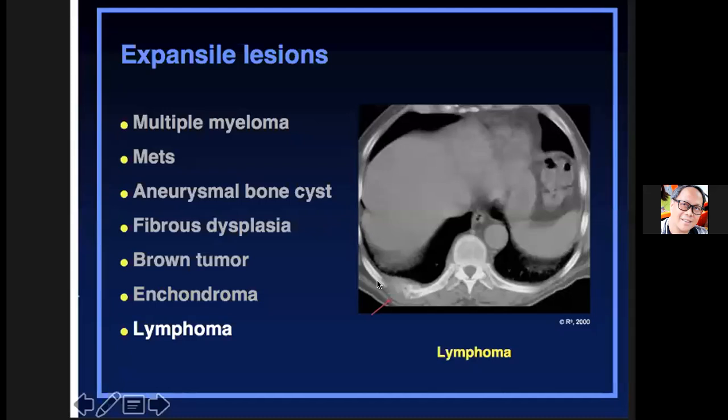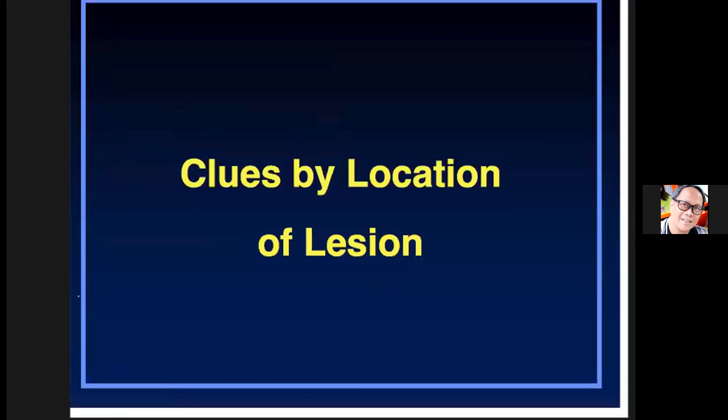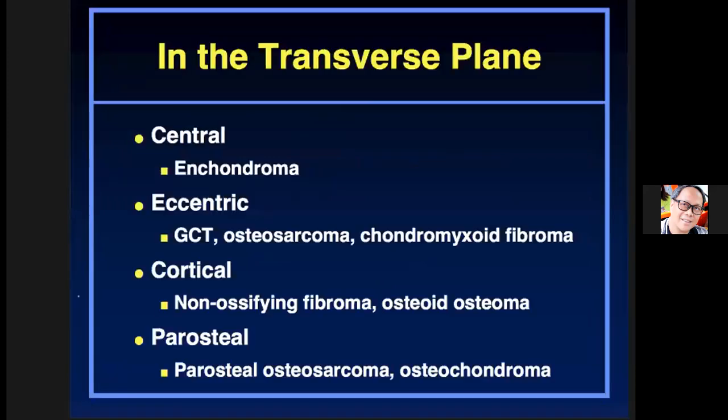Okay. So some other conditions are also more or less in a particular area of the body. No. So if you imagine, for example, the long bone along the long axis, the central axis, starting from the center and going to the periphery, there are lesions that are found mostly in the central area and going from the center outward.